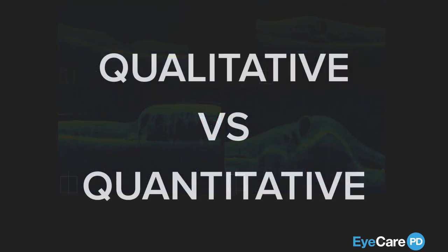But really what we've been focusing on is looking at the OCTs qualitatively. But there's a whole different way to look at OCTs in terms of quantitative analysis. So let's take a few minutes and actually break the OCTs down to understand a little bit more about quantitative analysis of OCTs.